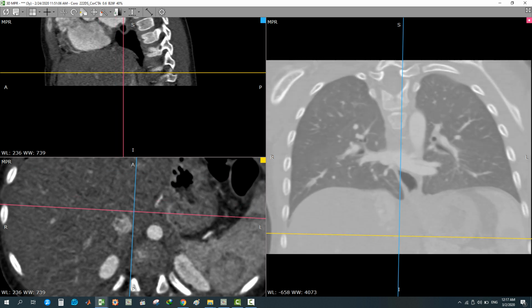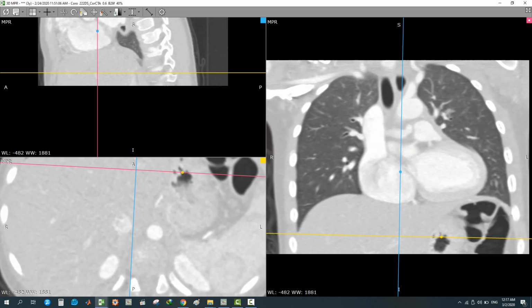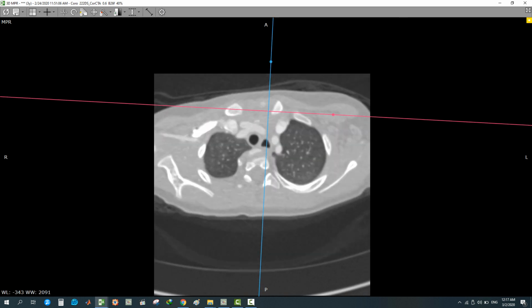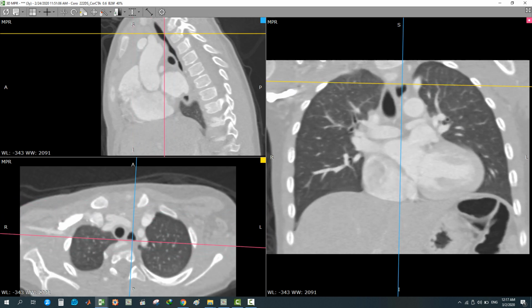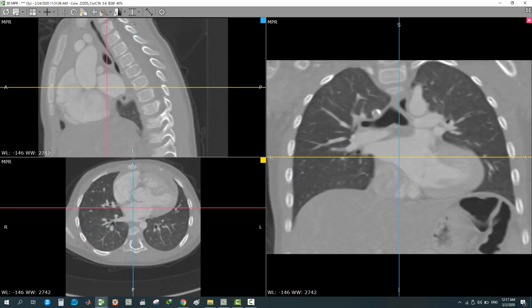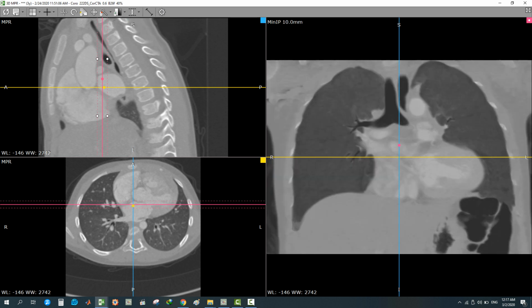After that you need to check the general items: vertebrae for butterfly vertebra or any congenital anomalies, lung window for lost lung fields, if there is consolidation, or CCAM, any pathology, and the axial like this, and airways for patency. Choose the coronal and reset first of all, and then choose the coronal plane, activate it by just one click, and then choose MinIP, adjust your slice thickness.